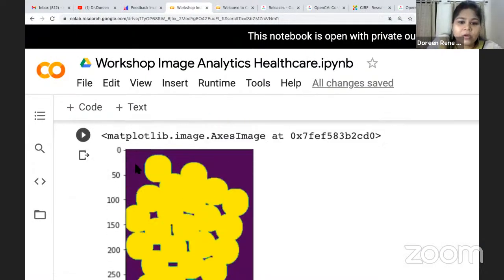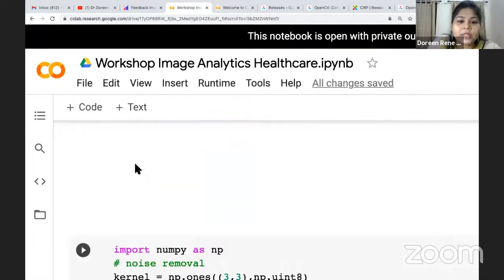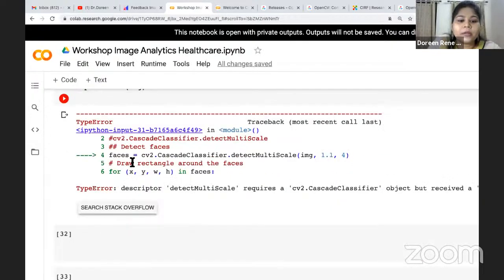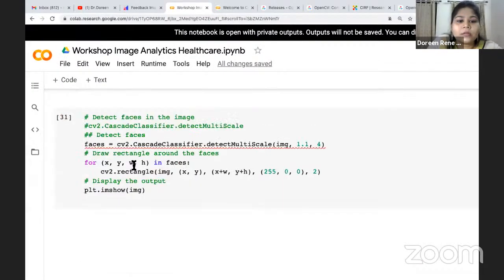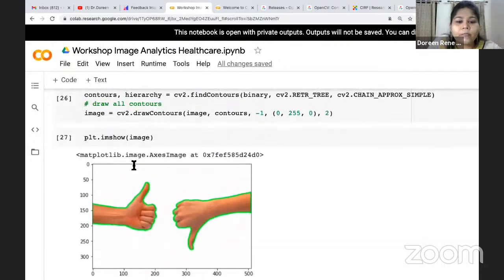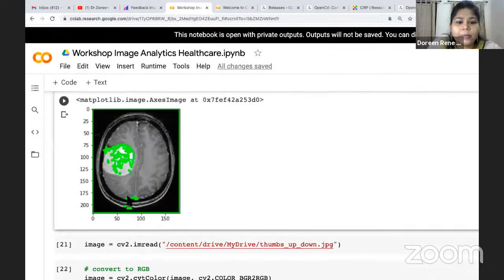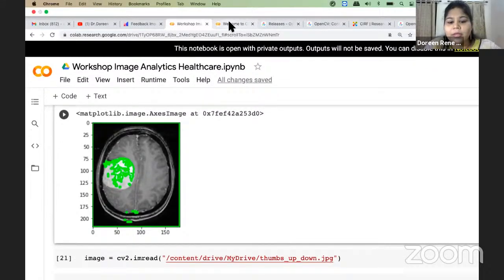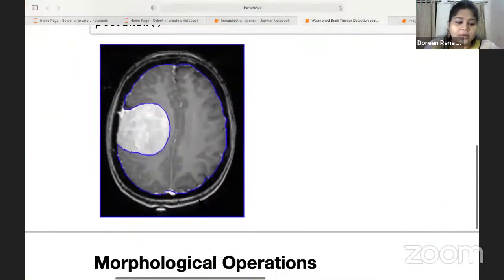When you took the contour, we had not done the segmentation, but even in the contour, what happened? Not this, not this, not this. The brain. Can you see here? A little? Yes, ma'am. Same thing. Here also it is done.